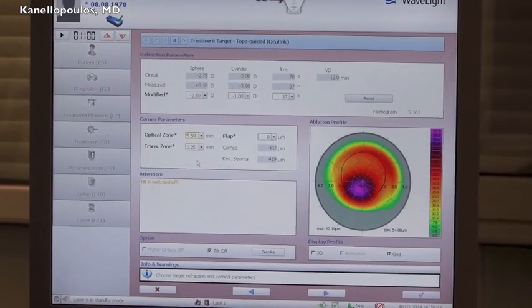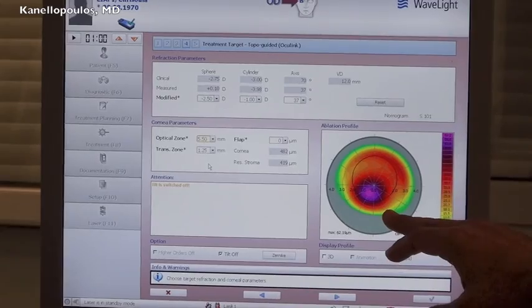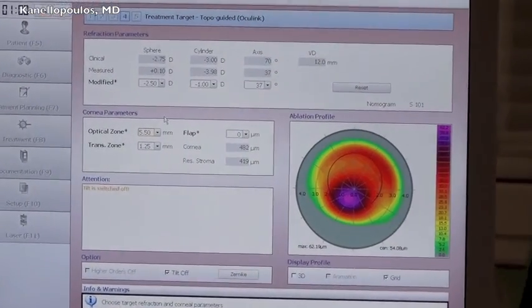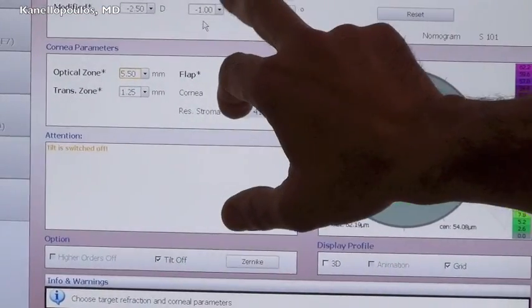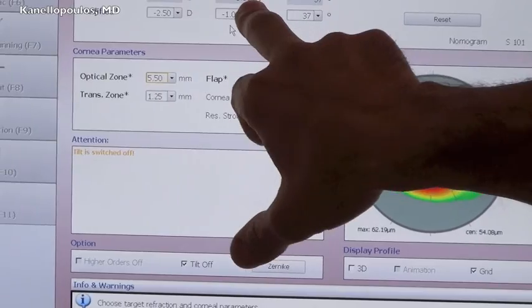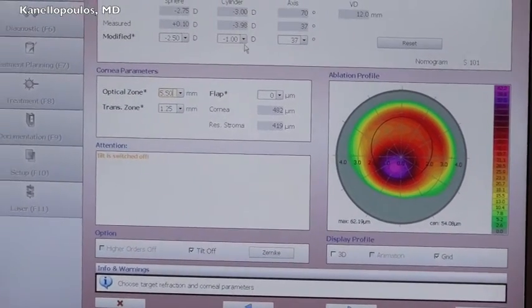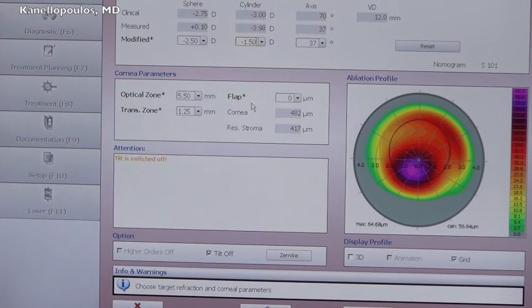This is probably the best medium between normalizing the cornea significantly and correcting some of the myopia and some of the astigmatism. Keep in mind that although the refractive astigmatism is 3 diopters, the topometric astigmatism is 4. So maybe then see what half a diopter more astigmatism will cost us in tissue.